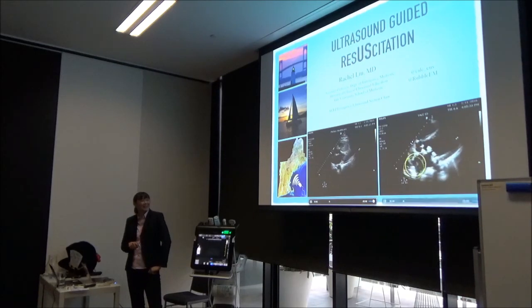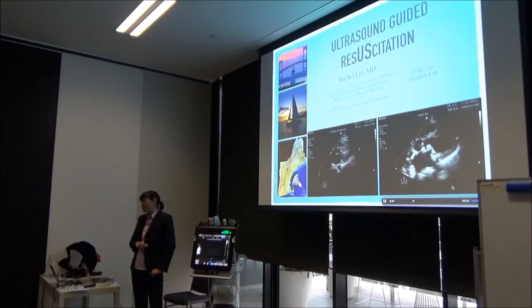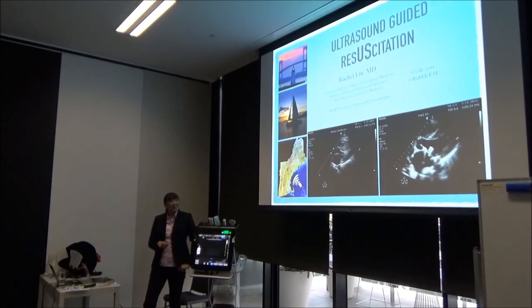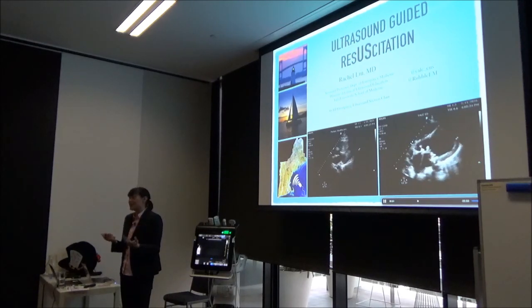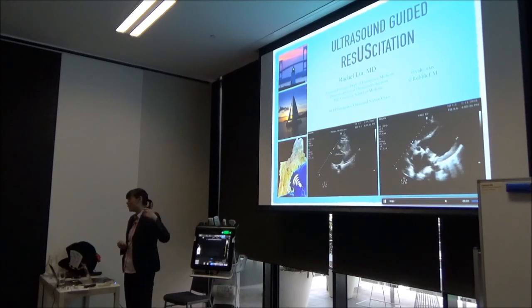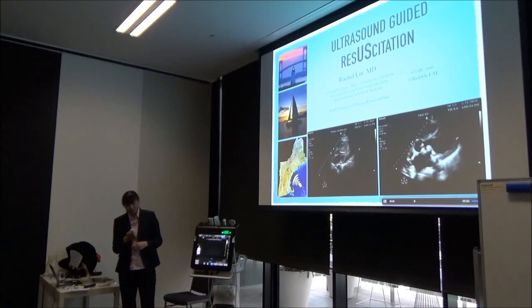How about this one? So, parasternal long view. And I'm going to start a hashtag that's called the dot right movement. So that supports our right-sided screen dot. Okay. This is endocarditis. These are vegetations on the valve. Now TTE isn't the most sensitive or specific for this, but if you see it on TTE, your specificity just went way up. So that's what that happens to look like on the mitral valve.